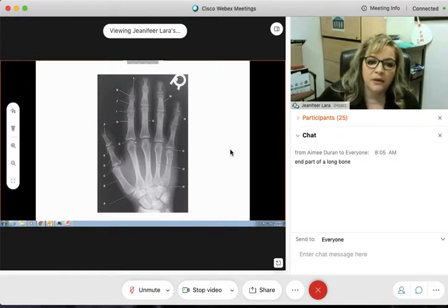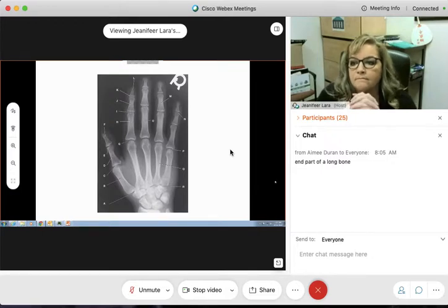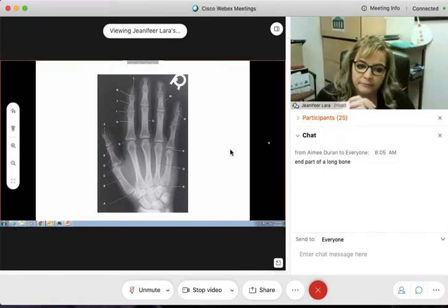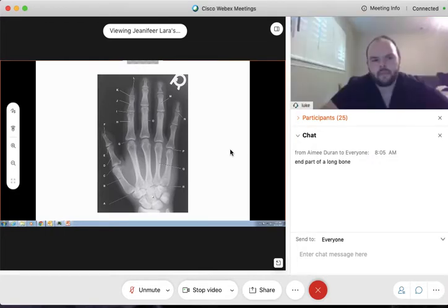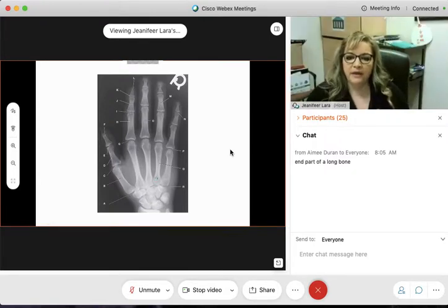Yes. Good, Sharon. What is G pointing at? Second MCP. The second MCP. Perfect. And Marcella, give me A. Is it the first CMC? Okay, good. And Luke, what is this carpal? Is it the capitate? There you go. Very good. Capitate, right? Awesome. Perfect. Now let's move on.